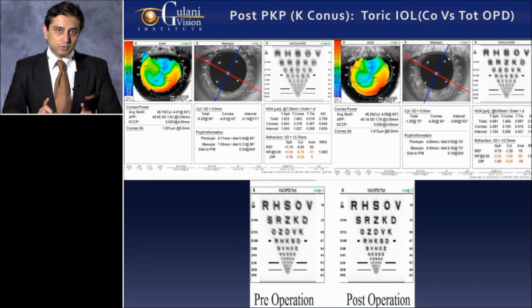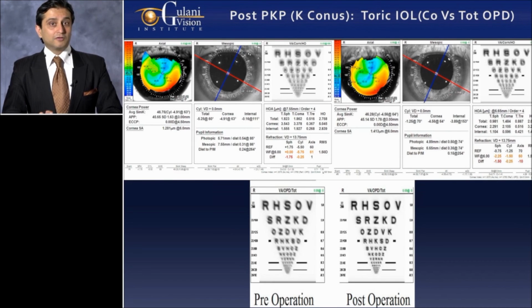And if you see the same patient in the next slide, you see here how the OPD shows us that the visual quality is poor with this transplant. But overall, total OPD of this patient, including the cornea, is actually excellent. So overall, the patient, despite that transplant, is seeing 20/25 and is thrilled with his vision and the freedom after so many years.